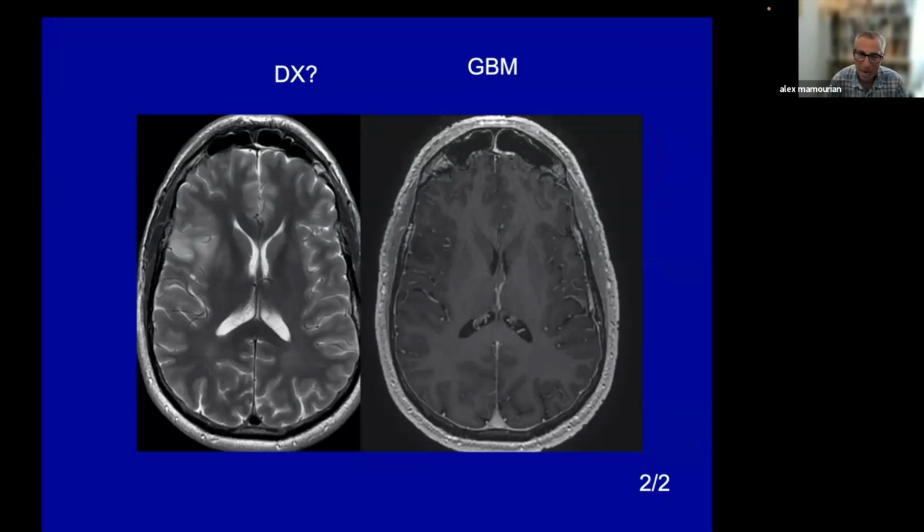So you won't expect to see this property of an intact blood-brain barrier, which is the case here. Glioblastomas can have some regional variation in the quality of enhancement, as you know. So this heterogeneity of enhancement strongly favors glial tumor rather than metastatic disease.